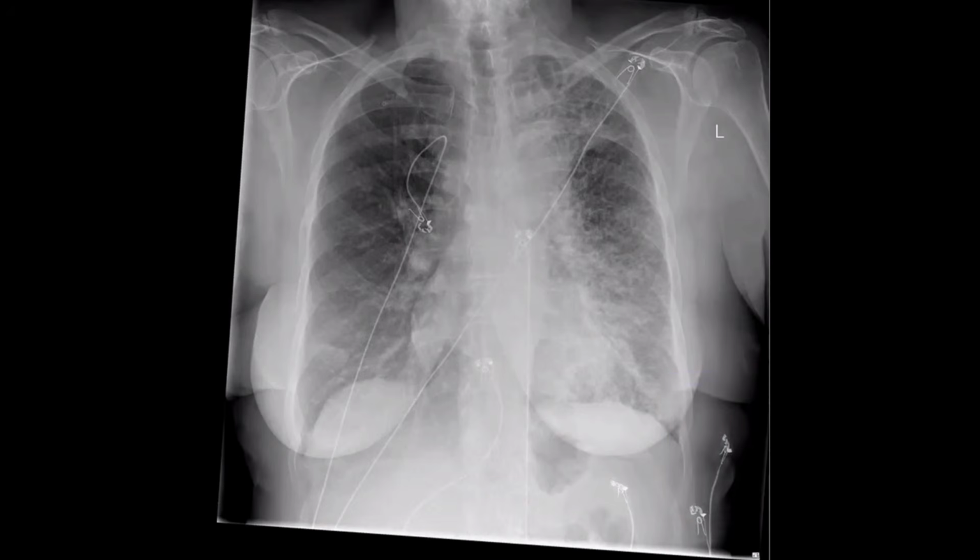I can appreciate that there is evidence of bilateral lung reticulations. Parenchymal reticulations are noted within both lung parenchyma. It appears to be more on the left side. Yes, you are right. It's not symmetrical. It is asymmetrical, much more pronounced on the left side.